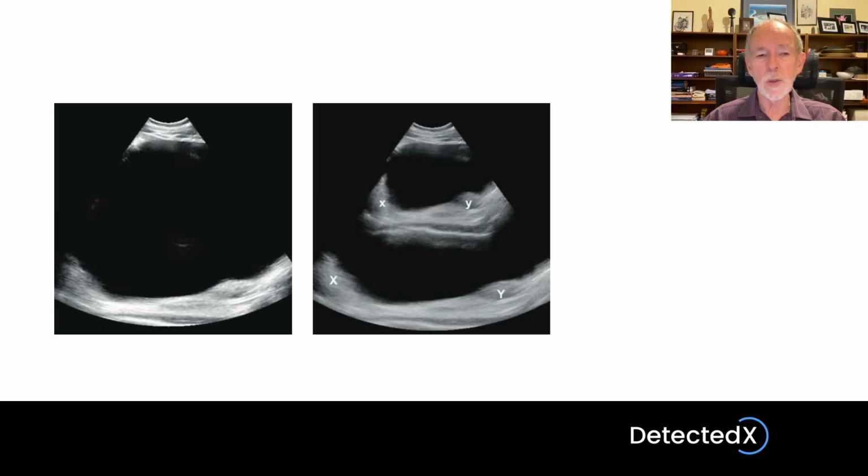Now, all the sonographer had to do to make this artifact go away was to go back to a more normal setting of the focus, and it disappeared. So this was basically an aberration. It can, however, occur when you're scanning in an area with much lower attenuation than the machine is expecting. The machine has to estimate the penetration depth so that it knows when it will be okay for it to transmit again. If the attenuation is very low, then penetration can be much larger than expected, and therefore the machine can wrongly estimate the limit of penetration, and therefore range ambiguity can occur.